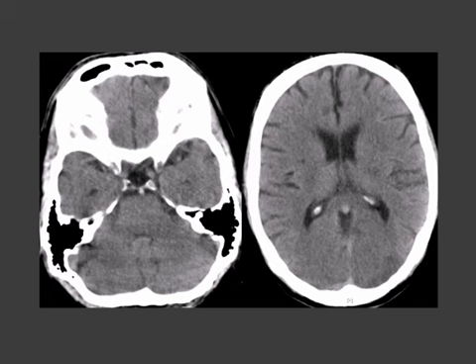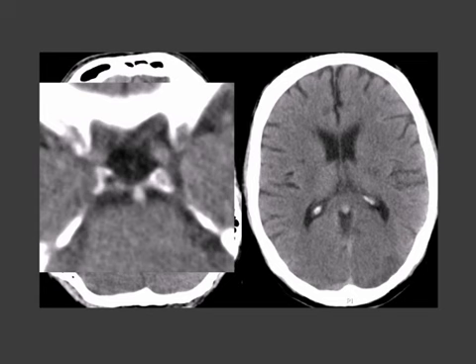If you look again briefly, you might say, oh, that's okay. It's certainly not okay. If you look at this, if I can zoom this image for you, then you will see that this basilar artery is certainly hyperdense, which is not good at all. And if you would look more carefully and go further back from this image, then you will see there is a certain difference in the occipital area with hypodensity on the left side.